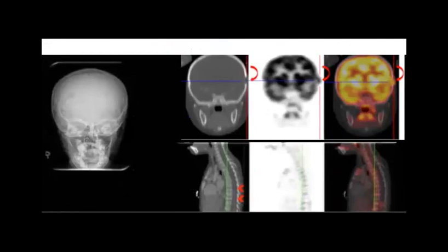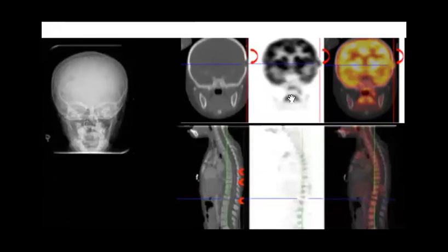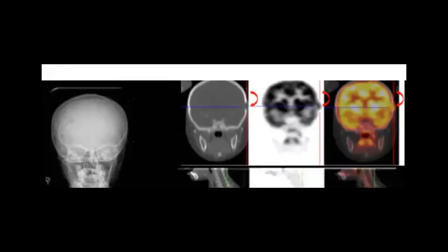I think we have about 7 minutes, maybe we can see this case. Try to find a solution for this case. So how does the skull appear?